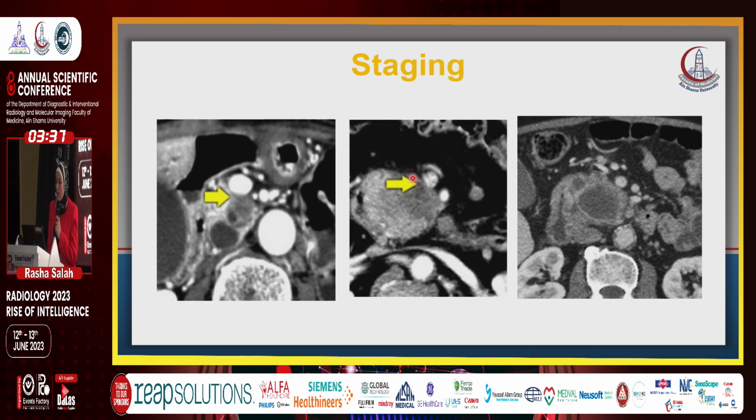There is a hair-like pancreatic tissue separating the vein from the tumor. So this is a resectable tumor because it is completely separable from the mass. Again, this is a huge mass from the first side.